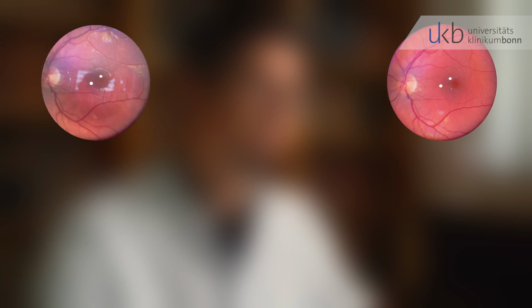These are because of too bright ambient light. You can reduce the reflex artifacts by optimizing examination conditions. Dim the light as much as possible and avoid any other light sources in the room beside your smartphone adapter.